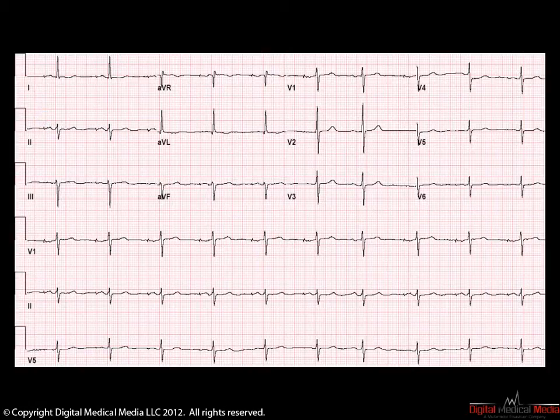This particular 12-lead ECG illustrates the importance of looking at every lead every time. ECG interpretation requires a systematic and organized approach to the review of the tracing in question. If you looked at every lead here, leads V1 and lead 2 both clearly have atrial pacing spikes which precede the P wave. The correct interpretation for this 12-lead ECG would be atrial pacing.